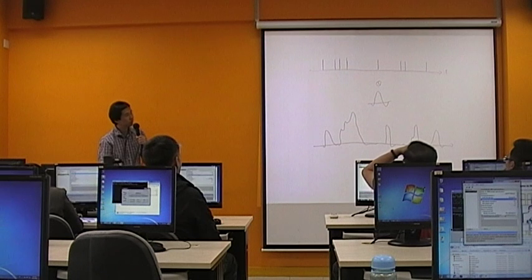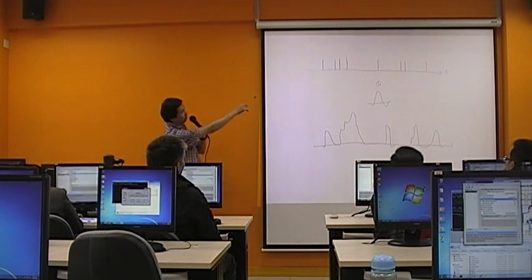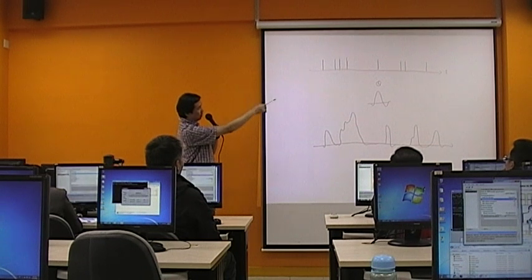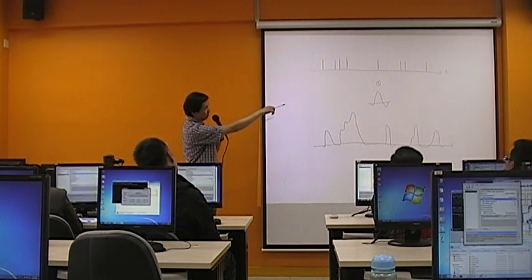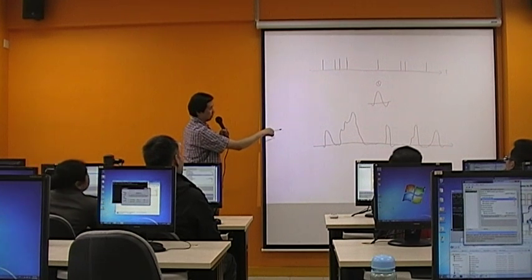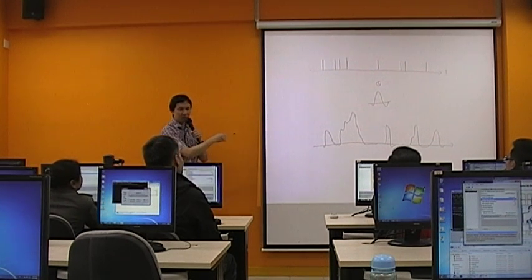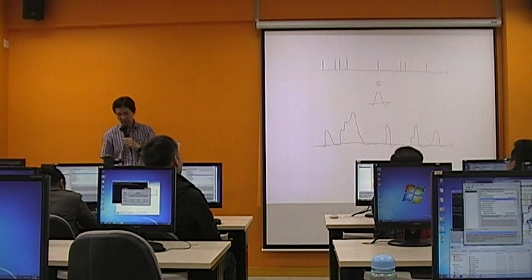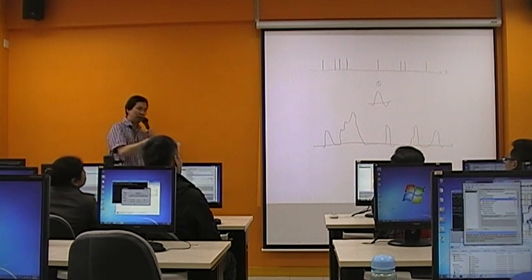Roughly. If you take a look at the onset of events at the top multiplied by the canonical hemodynamic function, you are expecting to get a time course like this, the expected time course. Here, it is in much higher temporal resolution than the one you have for your time course.